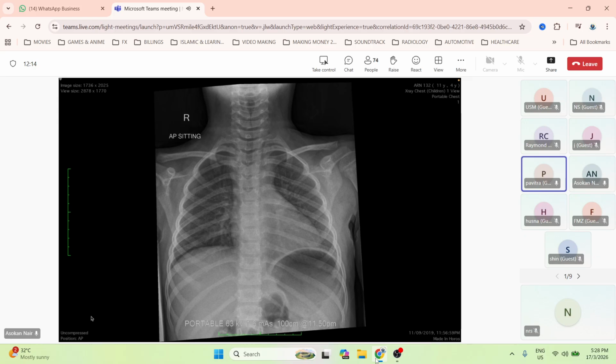So this is a chest radiograph frontal projection. Okay, I'm looking through the radiograph. The lung parenchyma is unremarkable. Heart borders are clearly visualized. There are no retrocardiac opacities. The trachea shadow at the cervical region appears narrowed.